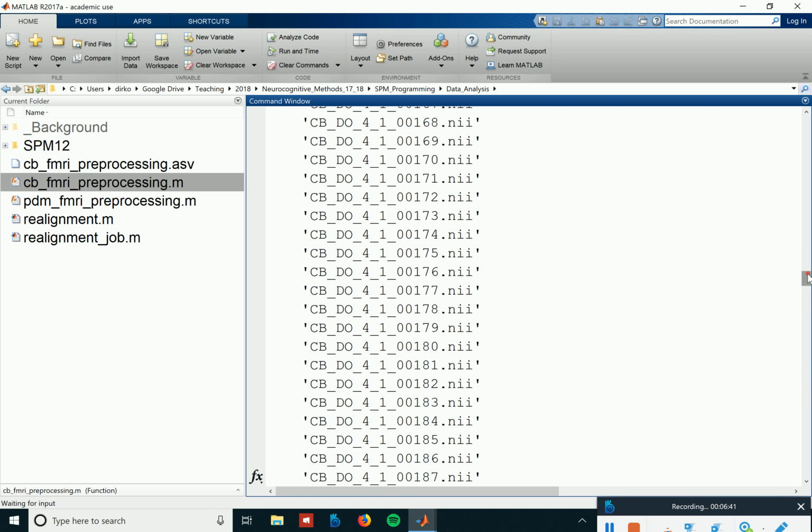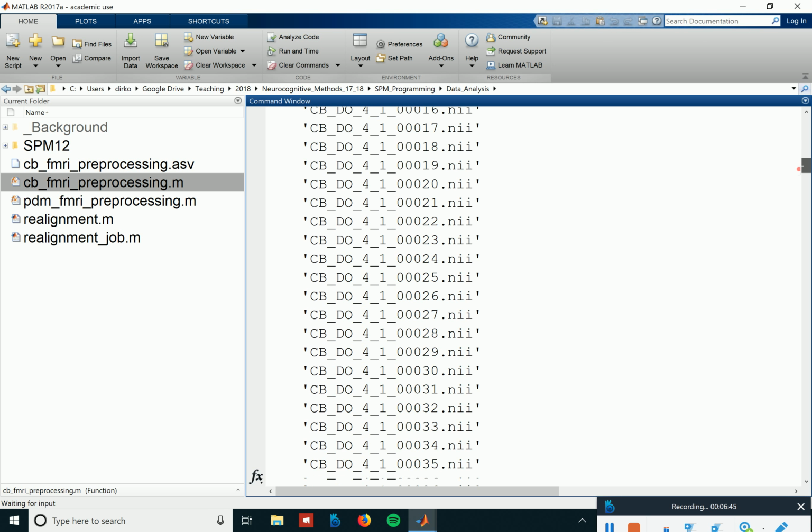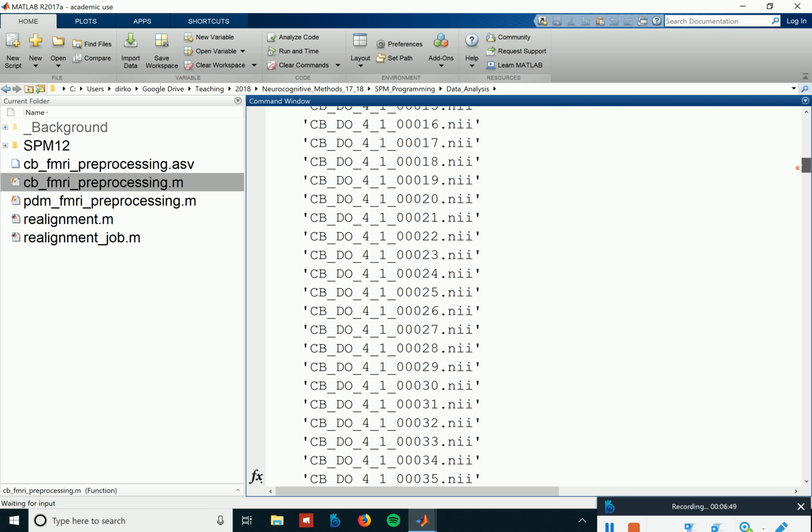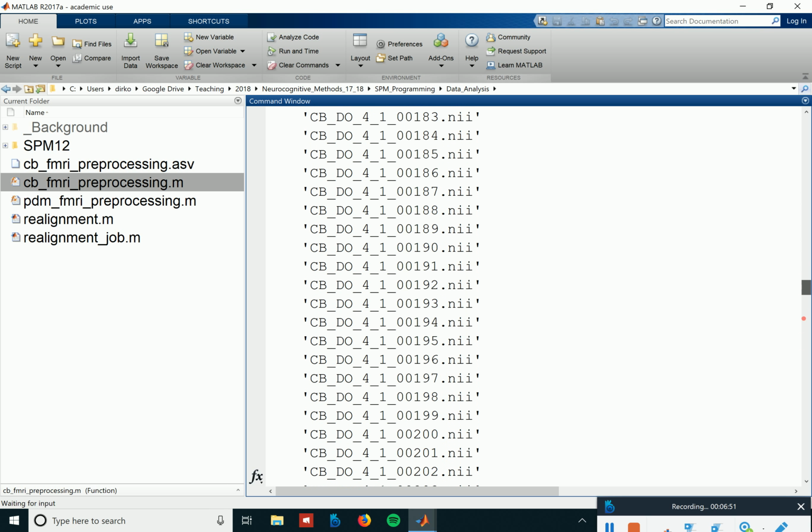So F is now the list of files. This might be that it was in a for a second run or so, now only ran the upper thing. I think for the first run that might have been the reason why it didn't find them.